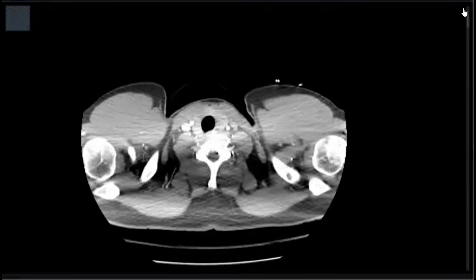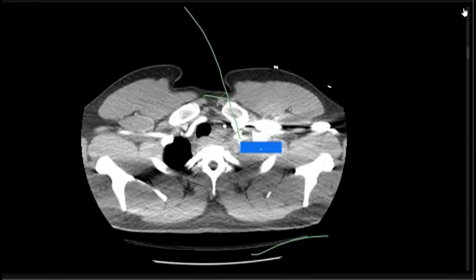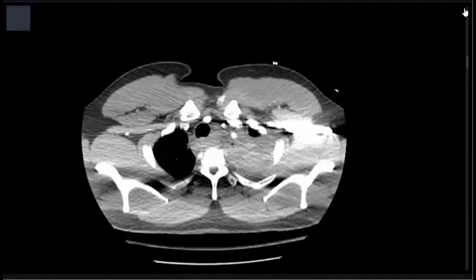Yes. So I'll just take a minute to go through the whole volume. This is a contrast enhanced aortic phase. I think it's a bit of lag while loading.